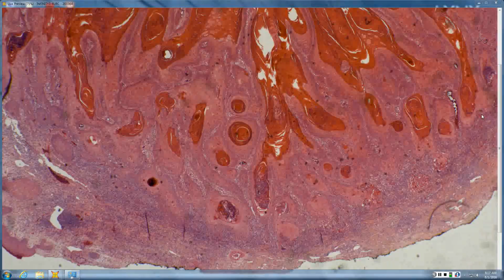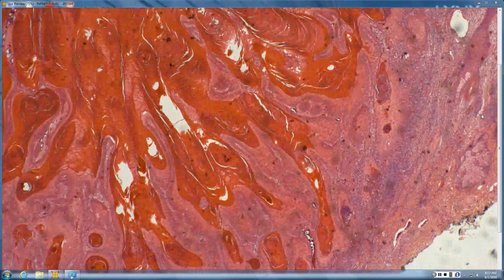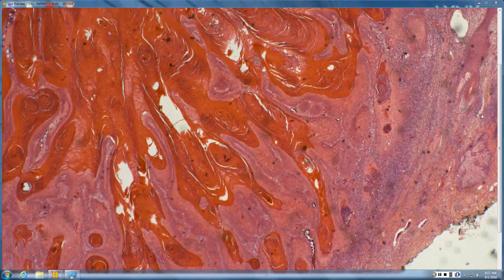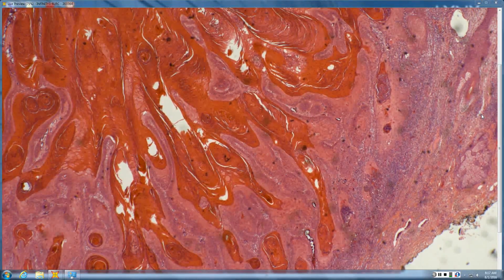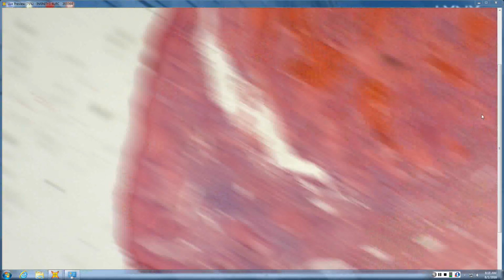So. This looks like a keratoacanthoma to me. Okay, so why KA? It looks like you have some microabscesses at the base. Can't see really what type of cell is in the infiltrate, but you have buttressing with a normal epithelium. Looks like there's some elastin trapping at the periphery. Yeah, elastic trapping, some neutrophil microabscesses, glassy. Hard to make out hypergranulosis in the center. Looks like no acantholysis. So, agree. Crateriform. KA.